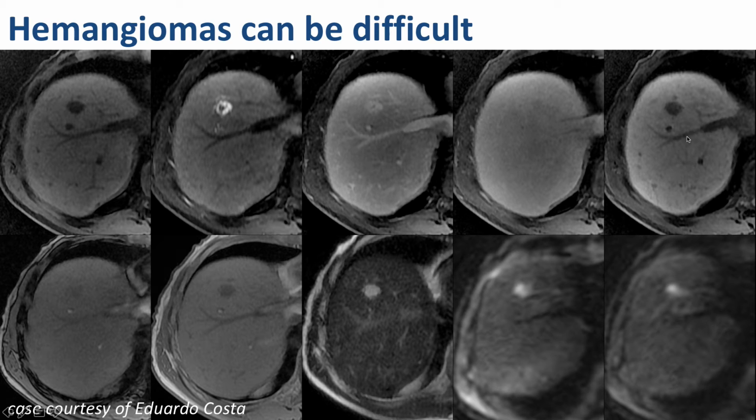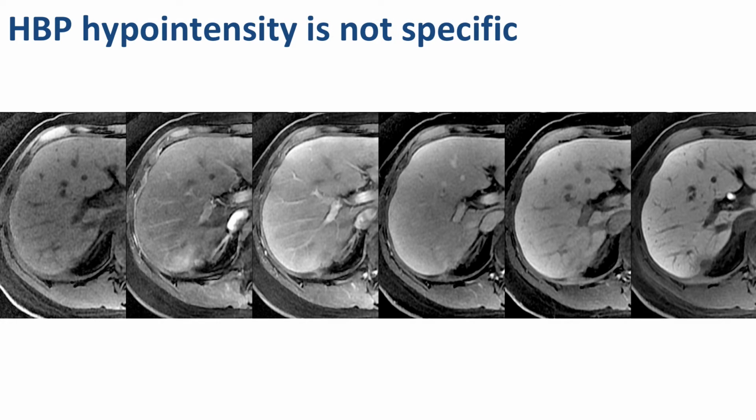Now, I got this case correct, but we all have our humility, don't we? Or we all are shown our humility, or shown that we should be humble. So here's one of my more embarrassing cases. Here's a 45-year-old woman, and she has a long, long history of birth control pills. She's been on birth control pills since she was 7 years old. No, okay, I'm exaggerating, but a 25-year history of birth control pills.